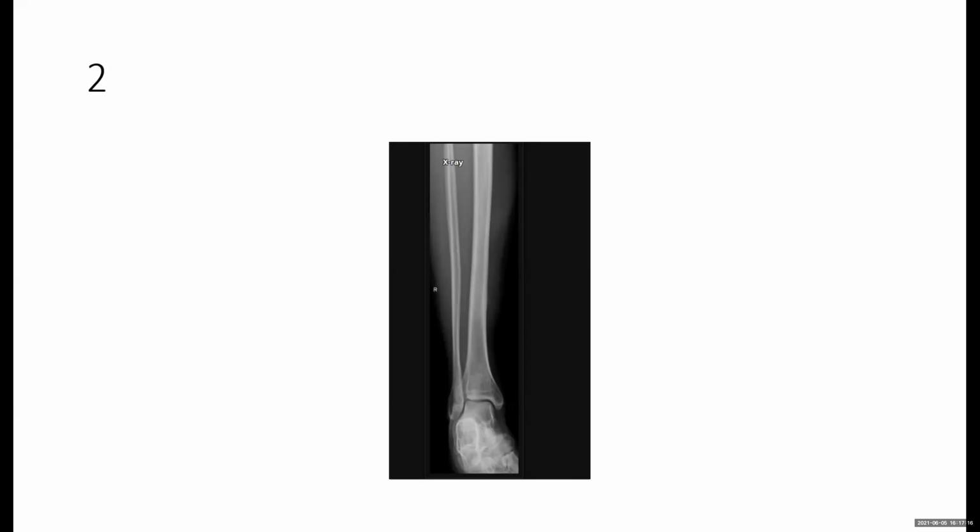Okay. Well, this is a frontal X-ray of the lower extremity, of the leg and ankle joint. I'm looking to the long bones and to the cortex. It looks intact. There is nothing obvious in the medullary cavities of both tibia and fibula that I can see. He's a 20-year-old with leg pain, okay? 30 years old. 20, okay.